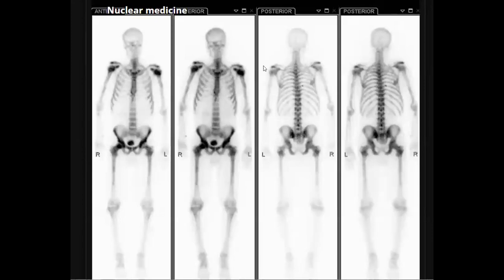So my question for you, is it metastatic or metabolic? Metastatic. Sure, that's metastatic. Why? The axial skeleton is mainly involved, and the proximal appendicular, which is typical for a metastatic super scan. So right now, this patient has a progressive course. Don't forget. Take care with such tricky cases.